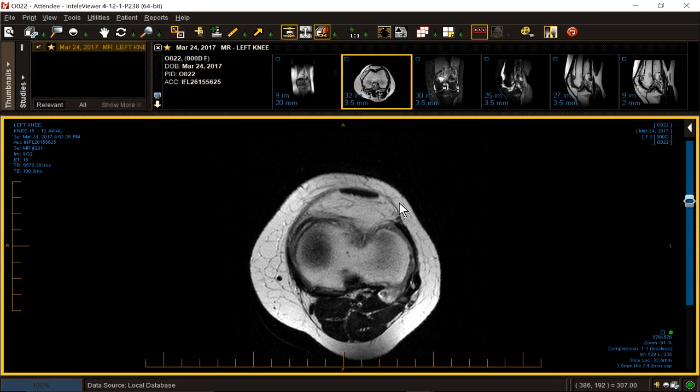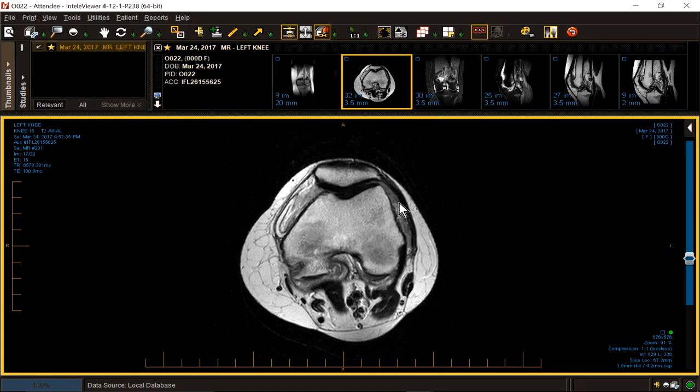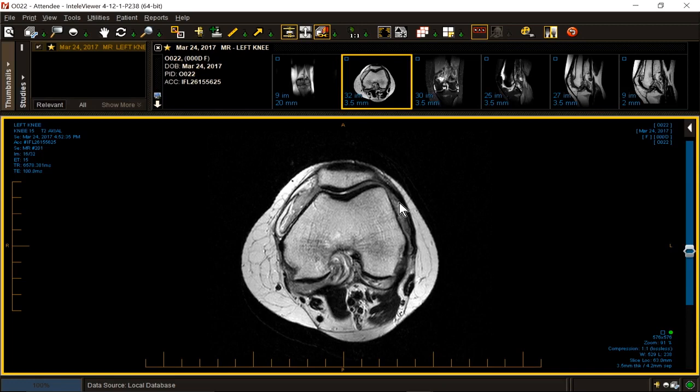23-year-old woman. CPPD? Never fills a joint like that. PVNS? Not dark enough. Amyloid? Rare. Usually with blood. It's a woman. She's 23. She's got an effusion. And inside of that effusion, she's got gray material. Game over. It's RA or JIA. So she could be rheumatoid positive or rheumatoid negative. Frequently in JIA, they are rheumatoid negative, but they still have rheumatoid.